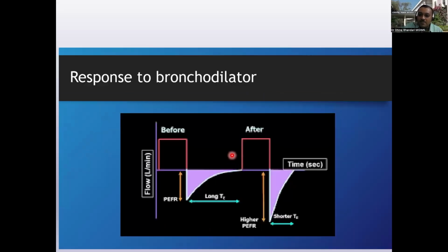Now, the same patient, imagine that he was having a COPD and everything, and you can see there's a long expiration time which is required for this patient. Luckily, we adjusted our ventilator nicely. We gave enough expiration time, so we could decrease the auto PEEP. But we still see that there is a long expiratory time which is required. So probably there is some amount of COPD or a bronchospasm or something.